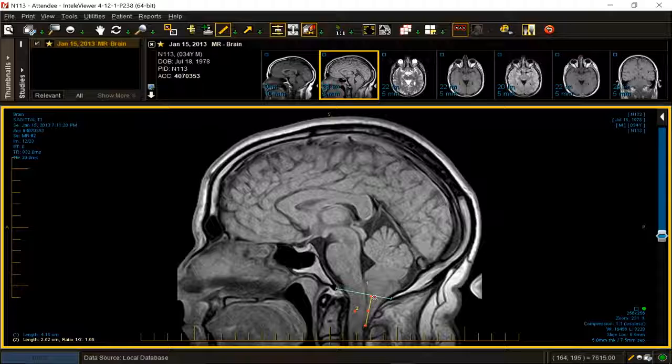We have pointed tonsils. We have a slightly smaller AP diameter of the cerebellum. The occiput is a little bit small developmentally, which is the cause of this abnormality. We have an ACM1. Let's talk about ACM1. In fact, let's talk about ACM. It's a mismatch between the posterior fossa and the cerebellum. We'll skip over the hydrodynamic theory or theories of Chiari malformation, but the syringohydromyelia is secondary.